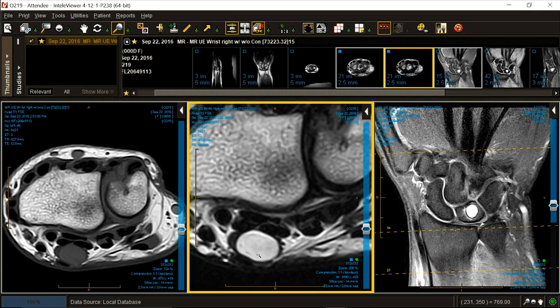It's white, which means it is very myxoid, mucoid, water-containing, high cytoplasmic to nuclear ratio. That's good, because a lot of bad tumors are packed with cells and solid, like medulloblastoma.